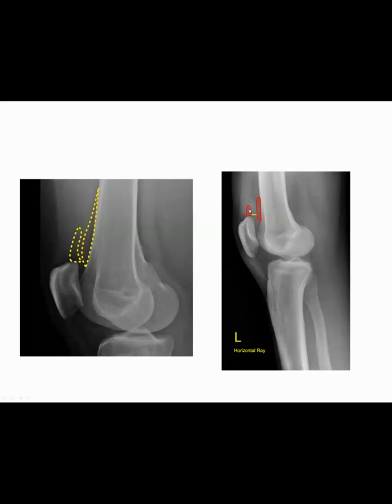So we have a widening of the distance between the anterior suprapatellar fat pad and the prefemoral, so pre-femur. And in between this widened space we have a soft tissue density here. So this can lead us to believe that there is a knee joint effusion and would prompt us to more carefully scrutinize the area in question in case there's an occult fracture.